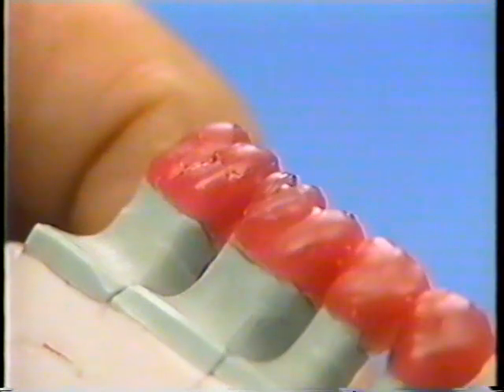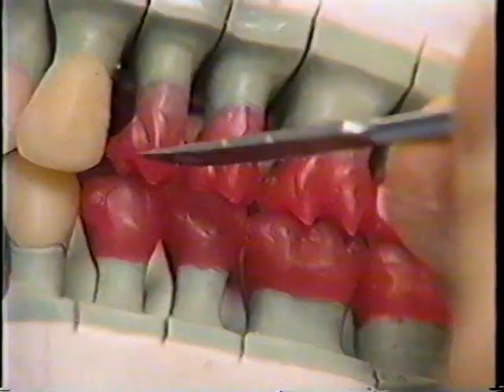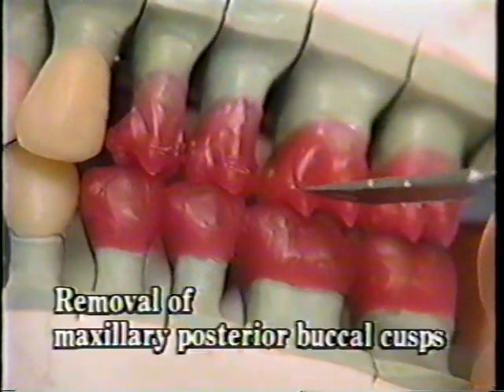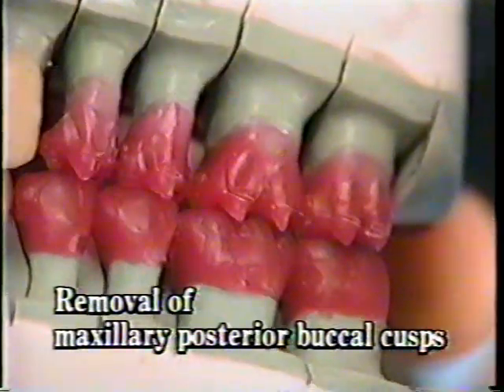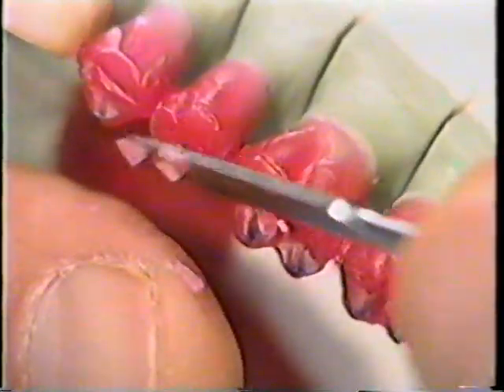By filling in the spaces between these points, we can easily design and shape the tooth contours to satisfy the three-plane concept. To enable us to check and adjust the occlusal relationship, we'll cut the wax rod slightly longer than needed to match the crown's actual height. We'll also remove the molar's maxillary buccal cusps to avoid hindering formation of the occlusal plane.